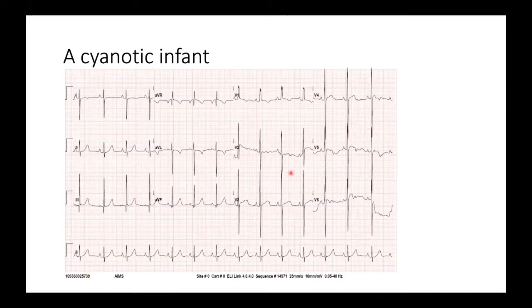But if you see a patient with Eisenmenger, all the Eisenmengers will have severe PAH. So they will have a different type of ECG. They will have a right axis deviation, RVH with strain pattern, which is not there here. QR in lead V1 suggests that there is a pre-tricuspid shunt like an atrial septal defect. Here it is a different type, TOF. Though there is an RVH, you do not get a classical RVH in TOF. You get a right axis deviation and an RBBB pattern in V1, which suddenly gets a transition to V2. So this is a typical feature of a TOF ECG.